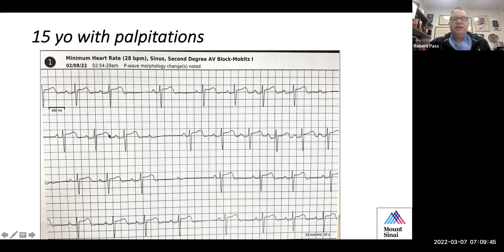This is also highly characteristic of Mobitz I block. So Mobitz I block when you're asleep is not generally a worrisome finding. It's a normal observation seen in people when they are asleep. So generally speaking, when I see a single dropped P wave during sleep, I don't get particularly bothered, even if I don't even see PR prolongation.